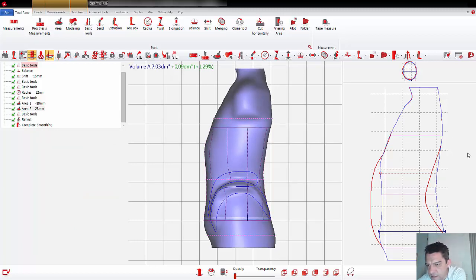Okay, you can see that at this moment we started with the 55.1 we had at the beginning, and now we have approximately 22, you can see on the top right corner, 22.1 degrees. If it's okay for you, you can leave it like this.